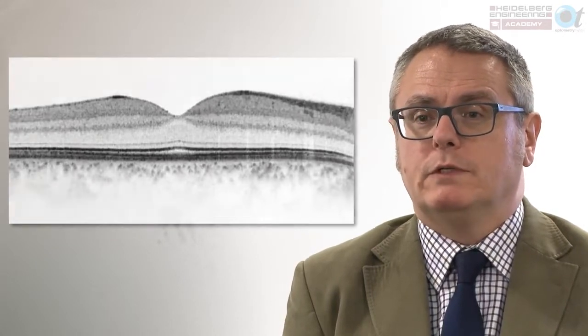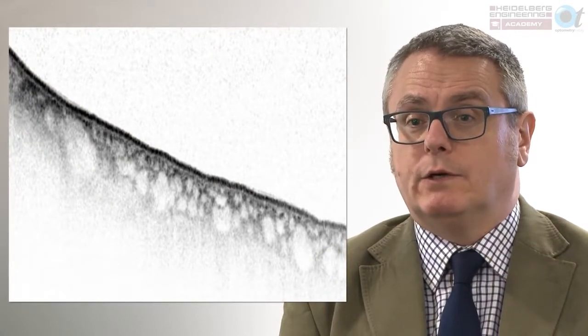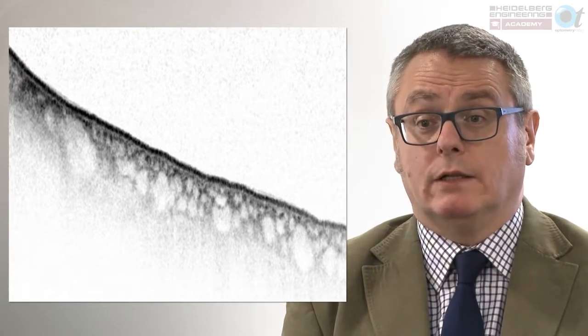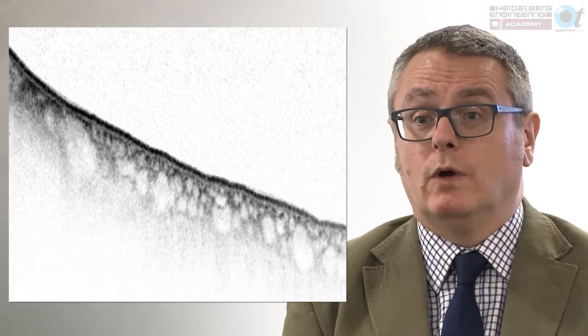So going back to first principles, this is an image of an eye that had been removed for a ciliary body melanoma. The anterior portion of the eye had been sent away for histological assessment, and the pathologist was then asked to remove the remaining vitreous gel and neurosensory retina, and the remaining eye cup was then scanned. The only structures visible, therefore, would be retinal pigment epithelium and Bruch's membrane. So the first hyperreflective band from choroid had to be the Bruch's membrane RPE complex.